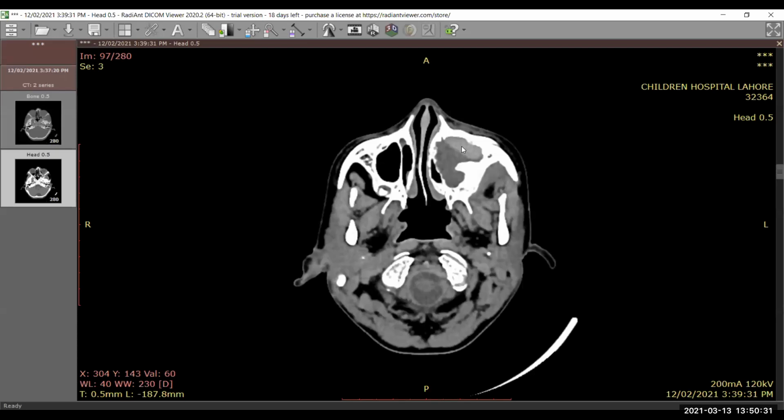Anything else in the sinus with infection? This can also be hyperdensity due to chronic sinusitis with fungal infection causing that hyperdensity. Yes, and this can actually be invasive, involving the adjacent bone as well, which is sclerosed, and there was chronic osteomyelitis of this bone as well.